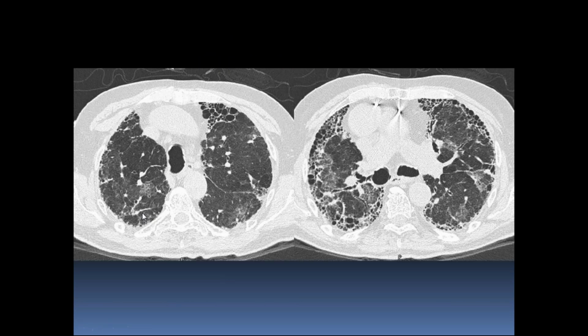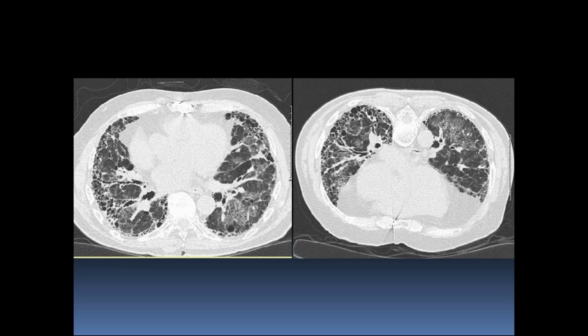So, moving on, got another entity to discuss now because we have a handful of them to go through. So this one looks completely different. We have two sets of images on this one. We have these axial windows, and then we have something a little bit lower.